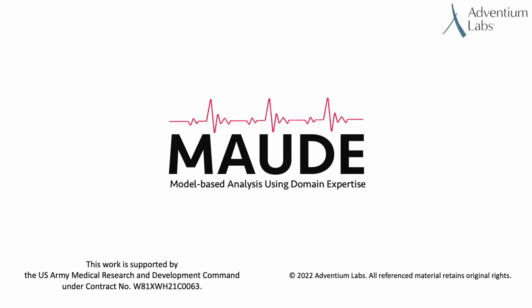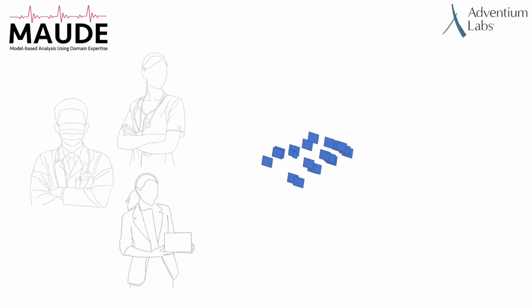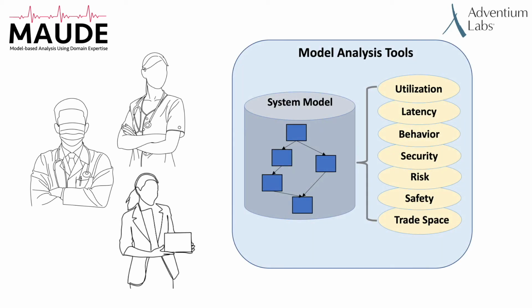MAUDE is a user-friendly platform that simplifies the design and analysis of complex systems, such as networks of medical devices in a hospital. It allows users, including those without expertise in modeling languages, to employ advanced model-based engineering analysis tools to create safe and secure systems that balance properties such as power usage, network capacity, processor speeds, and data protection.